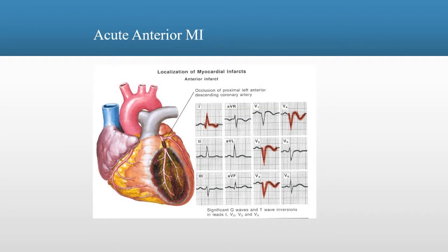Each time a 12-lead EKG is obtained, reading the strip with a consistent, systematic method is key. A pattern of reading emerges with this systematic approach. First, in this example, let's review the inferior portions.